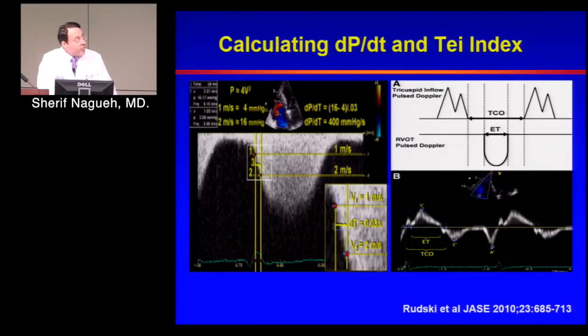How do we get it by pulse wave Doppler? On the left side, it is not a challenge to get outflow through the left ventricular outflow tract and mitral inflow in the same cycle. We can place the sample volume midway between the mitral valve tips and the LV outflow tract. On the right side, however, you cannot get the flow through the RV outflow tract in the same beat that you get to see the flow through the tricuspid valve during diastole.